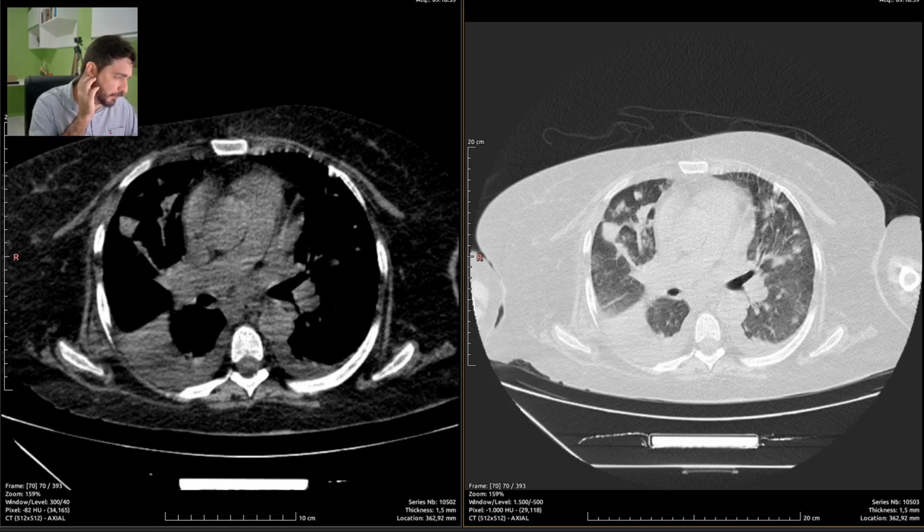I'll just summarize the report to make it easier for reading. Yep. And we are done with the chest CT scan of this patient. Just read once again to be sure I didn't miss anything. I know I didn't.